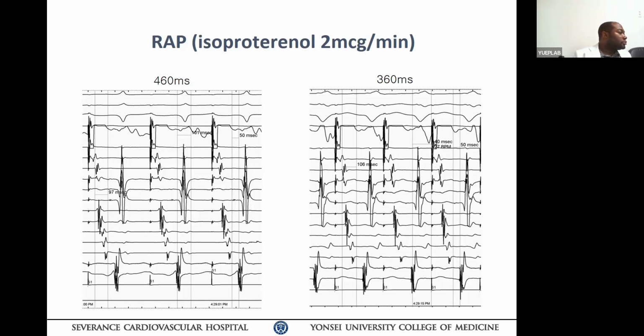Dr. Huang, do you think that this patient doesn't have a fasciculoventricular or any other different bypass tract, or just progressive aberration? I think it is probably just progressive aberrancy, because the overall axis remains pretty much the same, except the second lead that becomes biphasic.